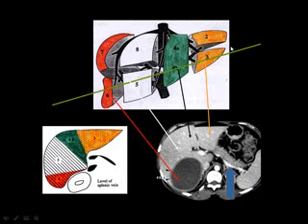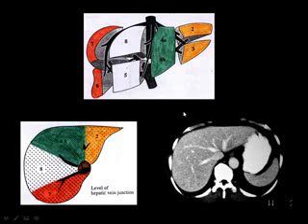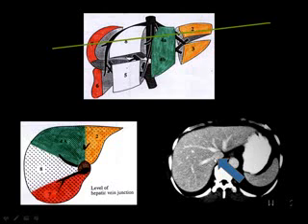Then in the inferior segments, the segments are, as I have said, 3, 4, 5, and 6. Then how do you know that you are in the upper segments? Look to the inferior vena cava. When the inferior vena cava is adherent to the liver, I mean lying in the fossa of the inferior vena cava and the visceral surface of the liver, then you are cutting in the superior segments.